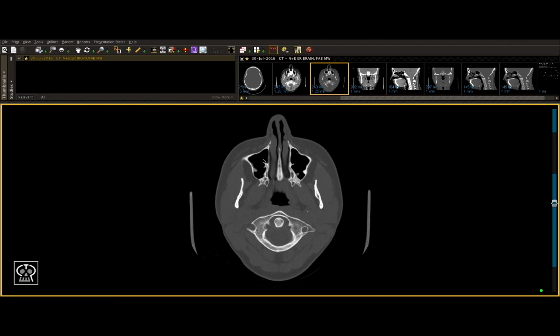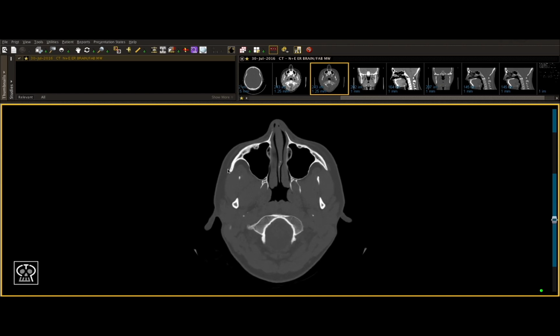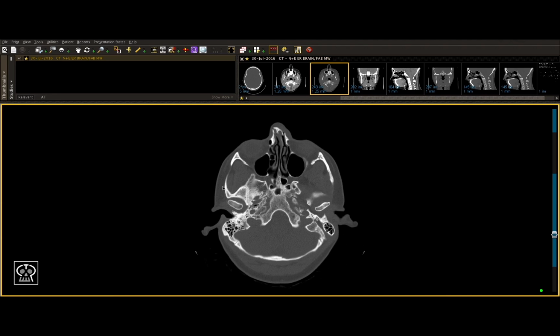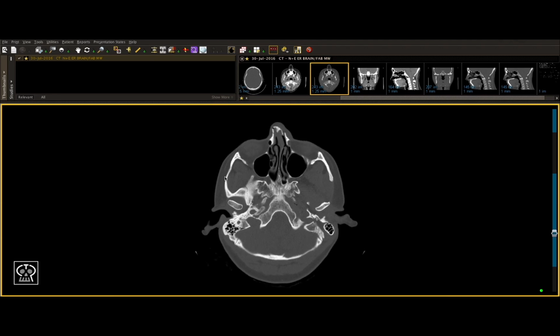The next step would be to look at the zygomatic arch. As we follow the zygoma posteriorly, you'll see it form a nice broad arch articulating with the temporal bone. And we'll see our ZT suture come into better view here.